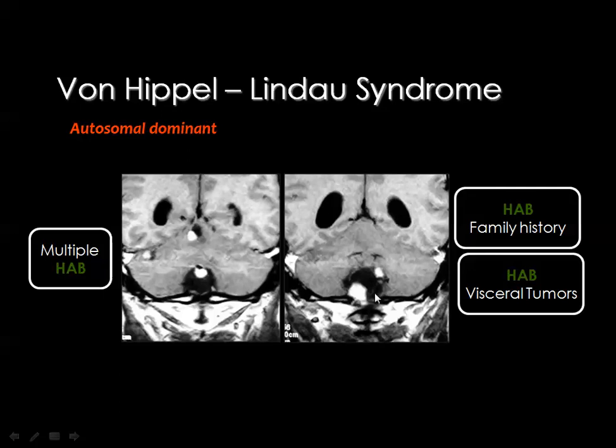And one of the important features here is that the cyst of the hemangioblastoma may be too small so that you cannot appreciate it, because the nodule is almost totally filling the cyst itself. And if you see a lesion which is classic of hemangioblastoma like this one, having two mural nodules, and you see a solid, a homogeneously enhancing lesion nearby, then you consider this is another hemangioblastoma, but you are not able to see the cyst because the cyst is totally occupied by the solid component.